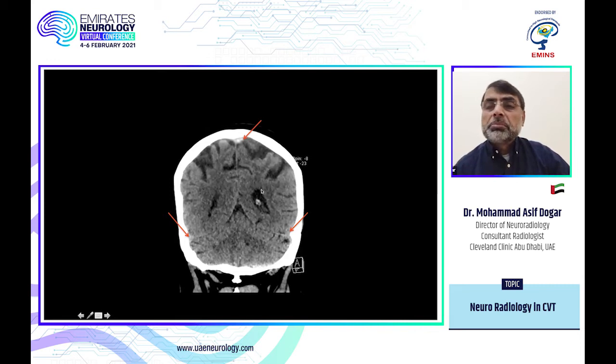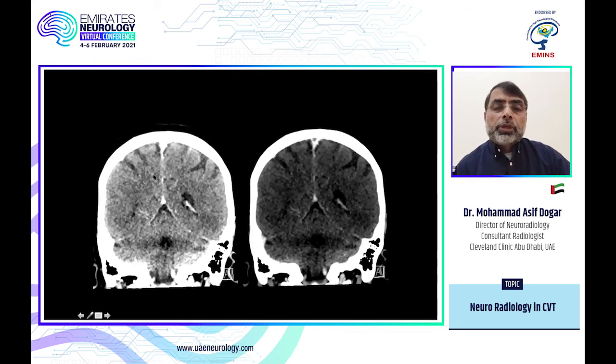Some people use some density numbers. I don't use that. It depends upon patient hematocrit, how well the patient is hydrated. I like this internal criteria of comparing the transverse sinuses and the superior sagittal sinus. So this differential density of the superior sagittal sinus is very worrisome for sinus thrombosis. Of course, we are going further to do CTV or MRV to confirm it. But again, we have to diagnose this on non-contrast plain CT. So here is the MRV, CTV. We don't see anything. As I said before, you have to change the window.